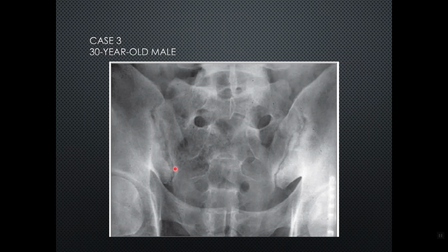Now, diagnosis in the spine can actually help you narrow down the differential, whether you're dealing with AS or psoriatic or reactive arthritis. We look at that elsewhere later on when we study different types of syndesmophyte. But in this case, purely from the learning perspective, again, marginal syndesmophyte and sacroiliitis are highly diagnostically suggestive of ankylosing spondylitis.